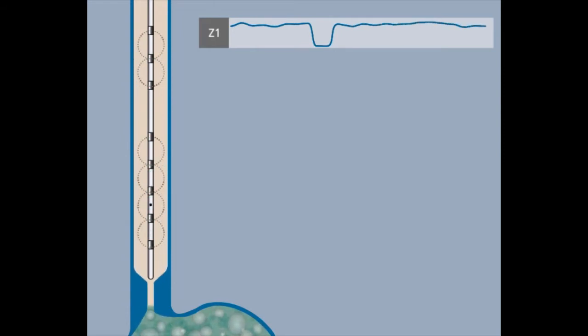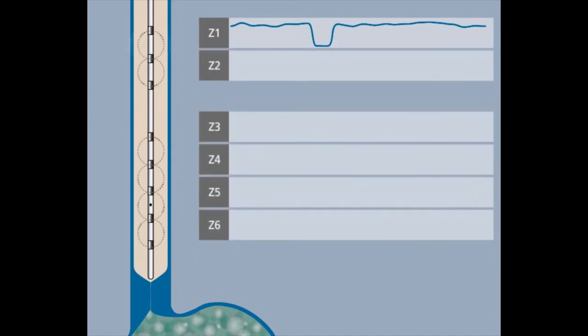The standard catheter, which is used to measure impedance, has 6 channels. Signals are measured between the rings on the catheter. In this example, the impedance channels are named Z. We will now show you what happens on all 6 impedance channels when liquid is swallowed.